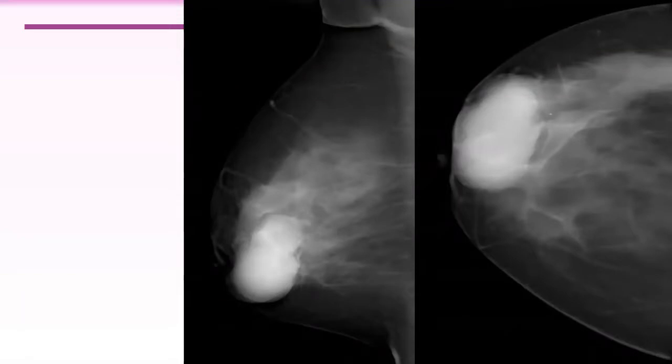You see, benign papillomas can behave like or mimic breast cancer. By time, this is the intracystic papilloma. After 3 years, it increases in size and infiltrates the adjacent nipple like malignancy.